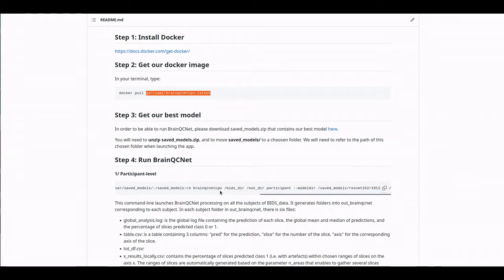After calling the app, by default, it runs the run.py script. This run.py script needs to have 3 parameters that are mandatory, with exactly the same syntax as all BIDS apps.